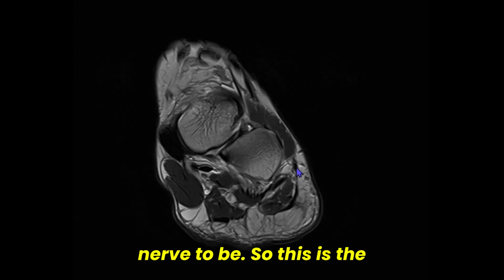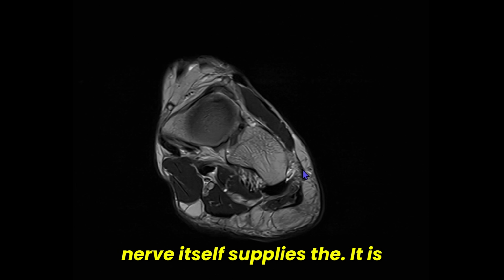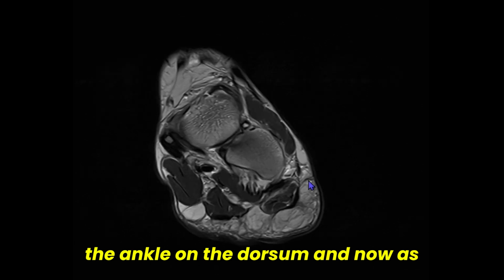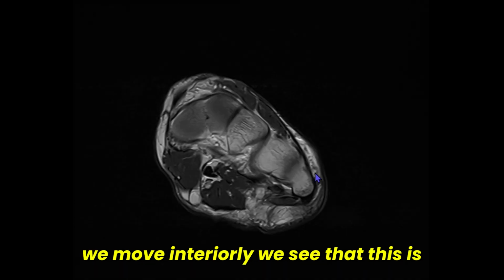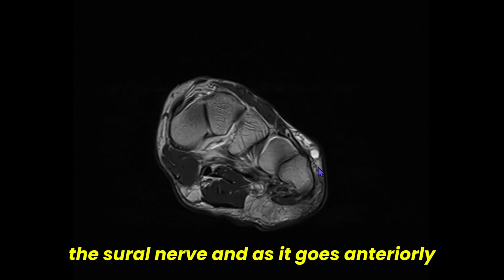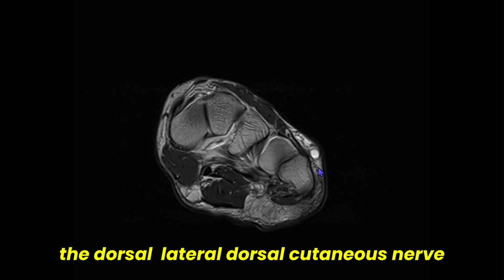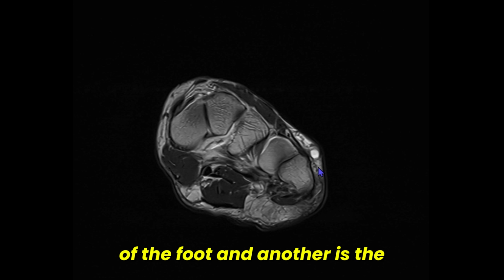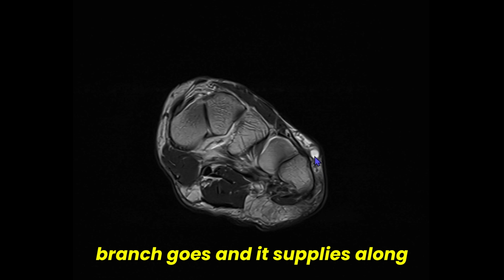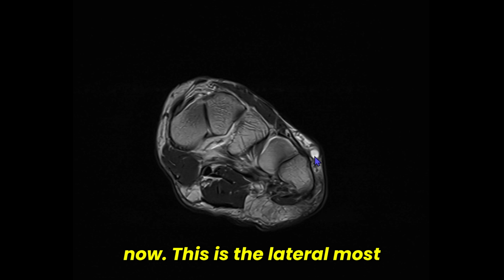So this is the region of the sural nerve, and the sural nerve provides sensory supply to the lateral aspect of the ankle on the dorsum. And now as we move anteriorly, we see that this is the sural nerve, and as it goes anteriorly it gives off two terminal branches. One is the lateral dorsal cutaneous nerve of the foot, and another is the anastomotic branch. The anastomotic branch goes and supplies, along with the superficial peroneal nerve.